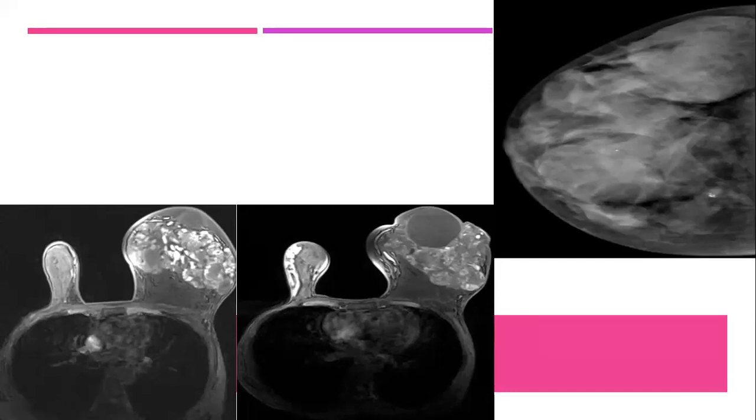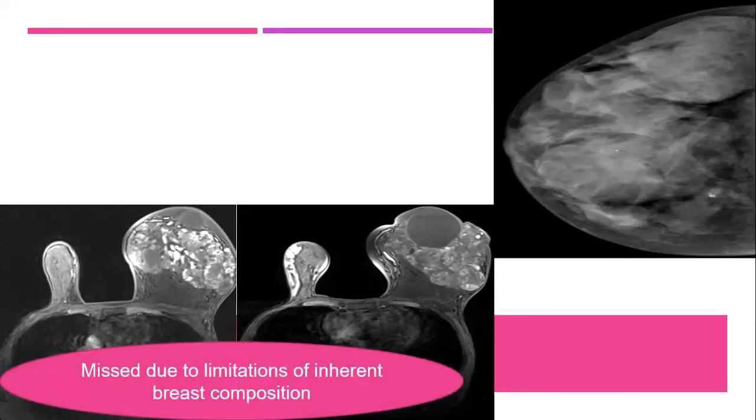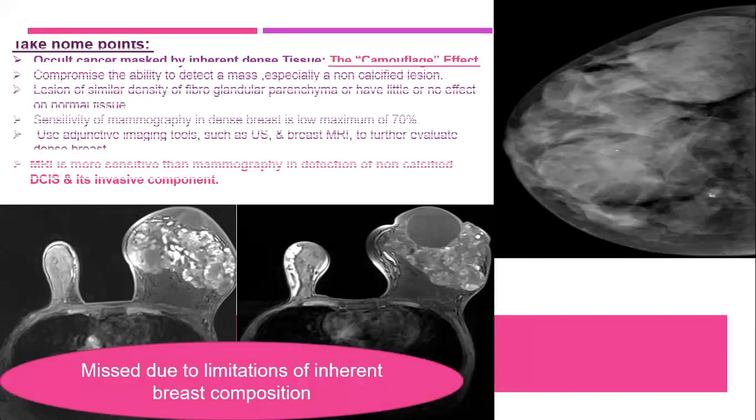See, in a patient demonstrating even ductal DCIS with microinvasions on the contralateral sides. So missed due to limitation of inherent breast composition.